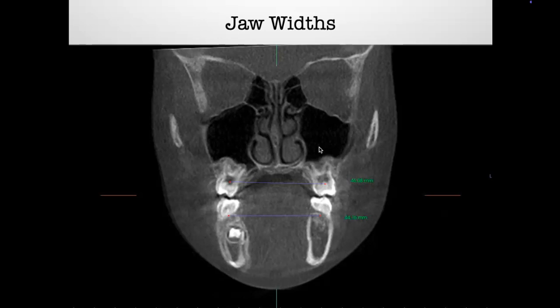So when we look at that measurement of the upper jaw now, you can see we're at about 46 millimeters. So we've gotten quite a significant amount of skeletal expansion, right? So this is great. This is good. This one responded better than others do, if that makes sense.